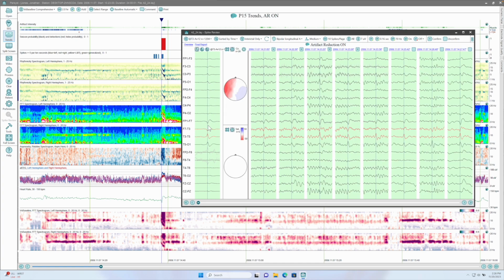By clicking on the group, you can see the individual spike events, as well as a summary and a voltage map. The voltage map on top shows a summary of all the spikes that have been previously selected as being exemplars or confirmed spikes. I can select more like this, and the bottom voltage map shows the ones I select. I can use this to confirm that they are similar to the exemplar spikes.